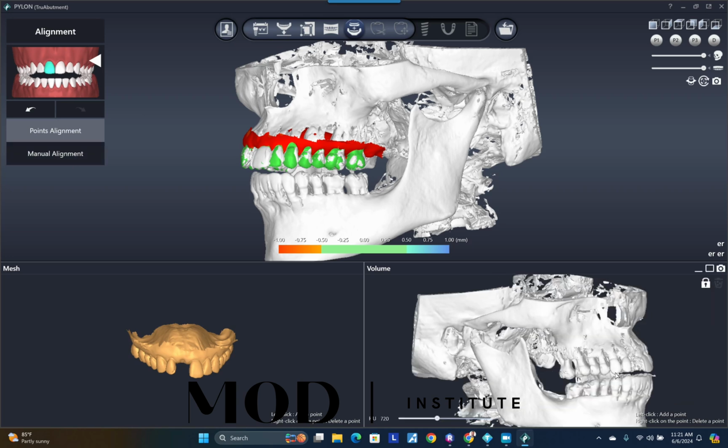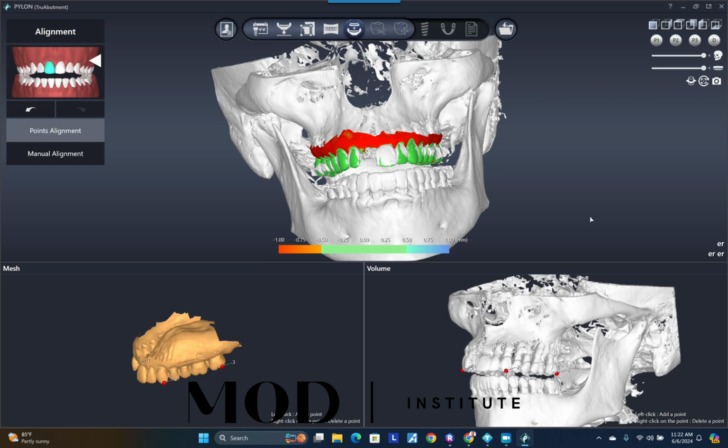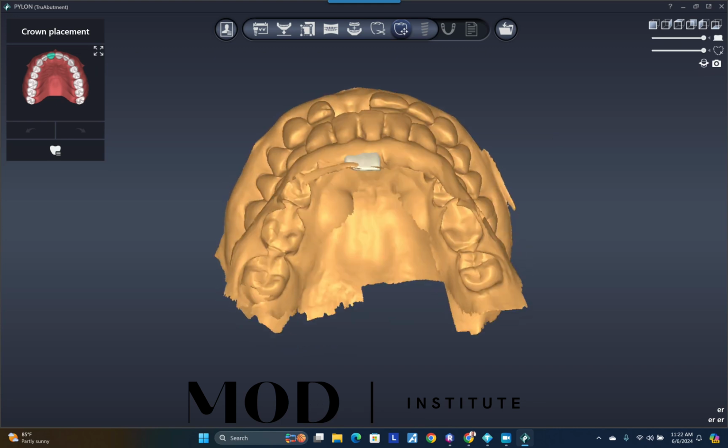If it didn't, you could go through a manual alignment, which I'm not going to go into because honestly, it seems to do a very good job at pinning automatically, and it gives you that color map. But the manual alignment is basically, like I just showed, clicking 3 common points. That's it, between the left and right images.